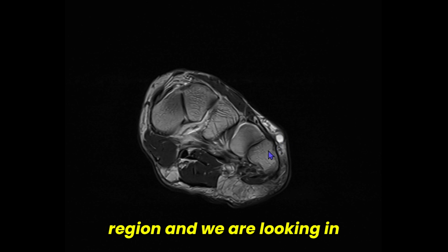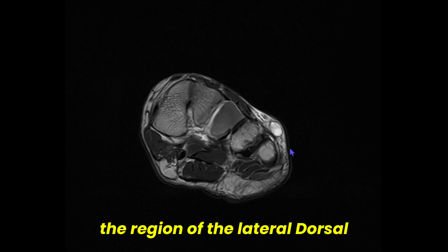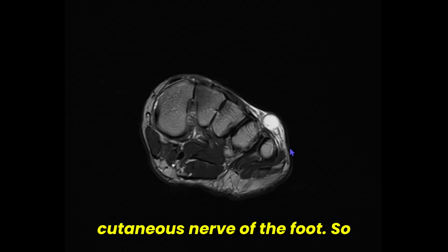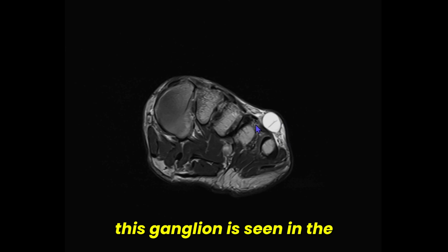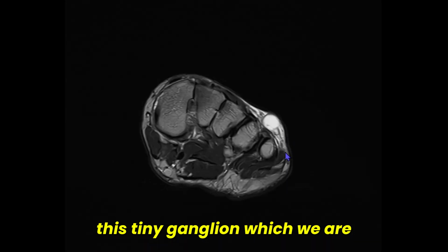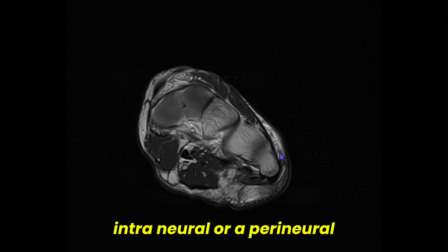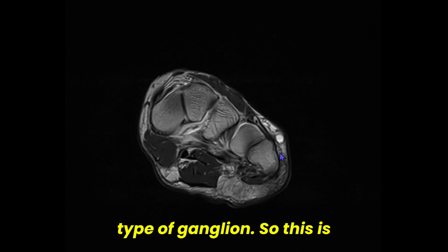So now this is the lateral most region, and we are looking in the region of the dorsal lateral cutaneous nerve of the foot. So this ganglion is seen in the expected location of this nerve, and this tiny ganglion which we are seeing can possibly be an intraneural or a perineural type of ganglion.